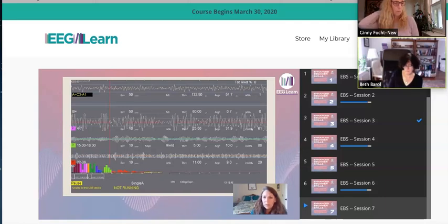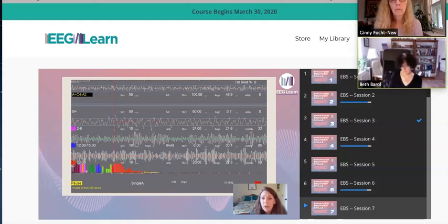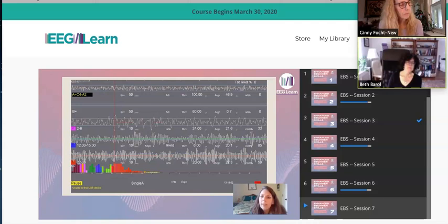Okay, so what's the next one? So here, and I know that we looked at this last week as well, but this is someone that has too much fast frequency activity in their EEG. And again, the average amplitudes will make that pretty obvious. But if this was, again, an adult, if we'd like that 2 to 6 hertz activity to be below 10, well, they've got too much of that. If we want the 12 to 15 hertz activity to be around 5 or 6 microvolts, they got too much of that. And then we go down to the 22 to 36, that should also be 5 or 6. And lo and behold, it's the very highest amplitude.